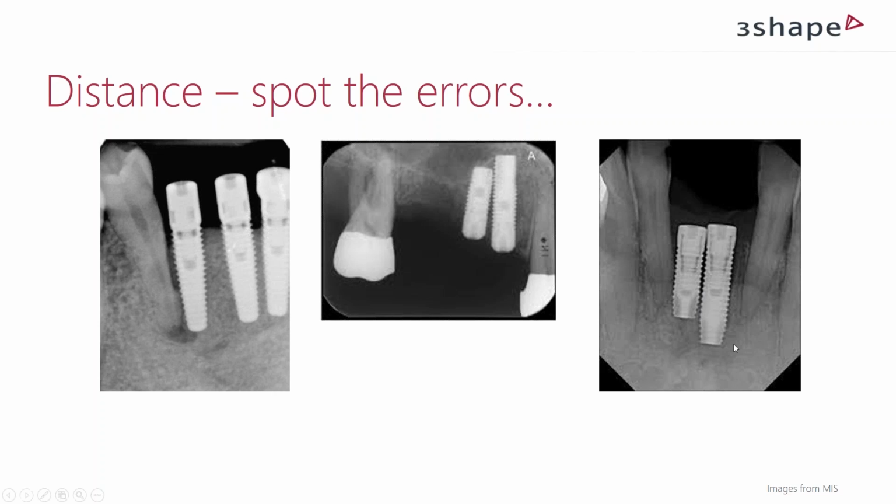So the only area that the implants are fixated in is the apical area, and as it looks, this might of course be an artifact from the X-ray image. Sometimes we can see these black and white areas, but it looks like this osseointegration is going away here as well. So a failure is imminent, and again very close to the apical part of the incisor.